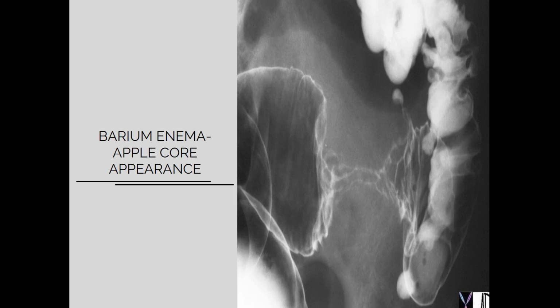This is also barium enema, and basically this is a very magnified view. Actually, I just want to show you the apple core appearance. That is actually the irregular narrowing, okay, along with the shouldering, exactly as we saw in the barium esophagogram, that there was irregular narrowing with shouldering. That was significant because that may tell us about the malignancy. So here exactly the same, the apple core appearance, that is usually a very suspicious finding, because that tells us that there may be malignancy. Okay.